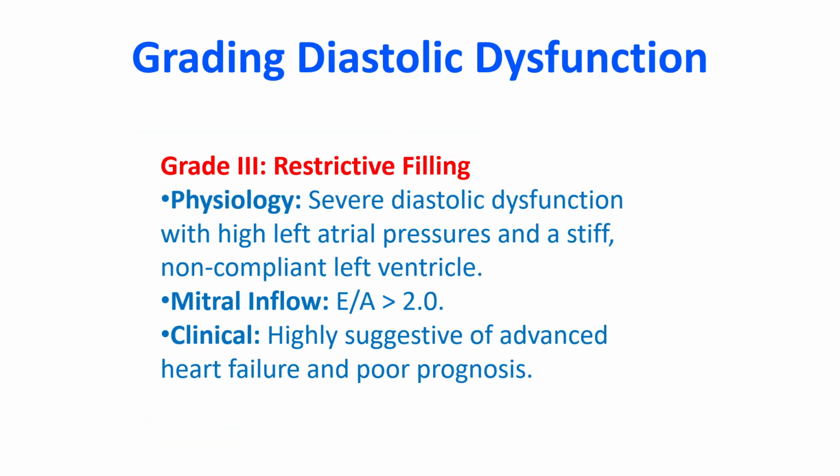Grade 3 is restrictive filling pattern. The physiology is severe left ventricular diastolic dysfunction with high left atrial pressures and a stiff, non-compliant left ventricle. Mitral inflow shows E by A more than 2.0. Clinically, it is highly suggestive of advanced heart failure and poor prognosis.